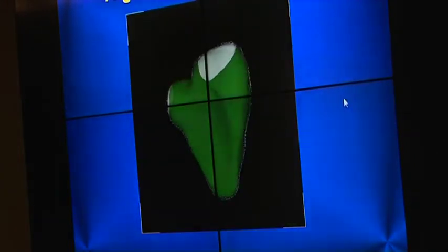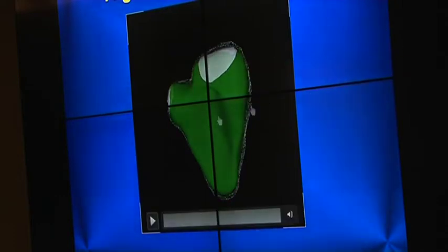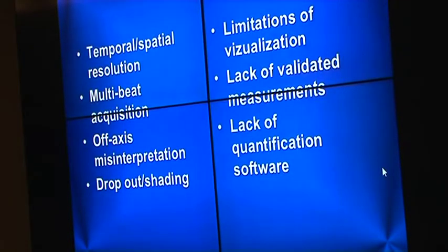Of course, the three-dimensional assessment of the right ventricle would be important. Philips can't provide this software, but this is a TomTec software analysis, which we also use in my institution in Budapest. Limitations are quite similar in the detection of the disorders.